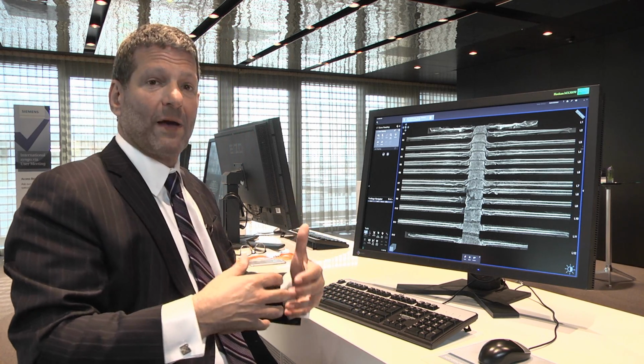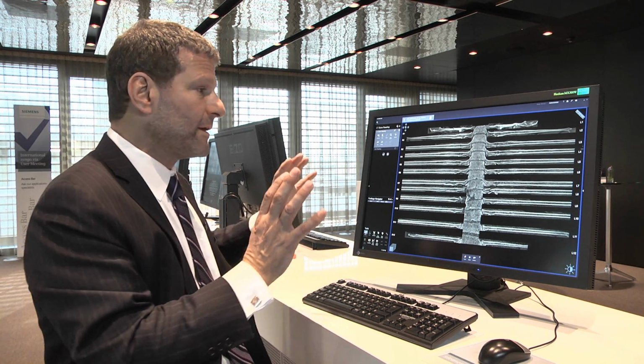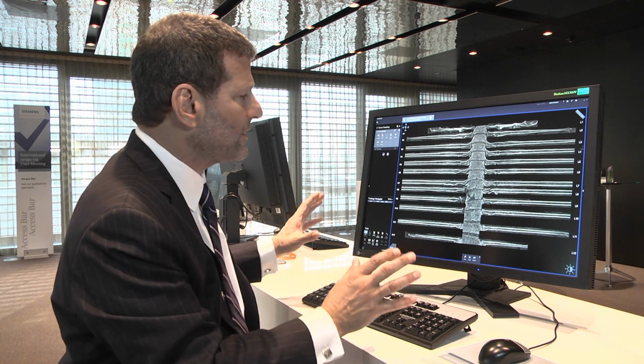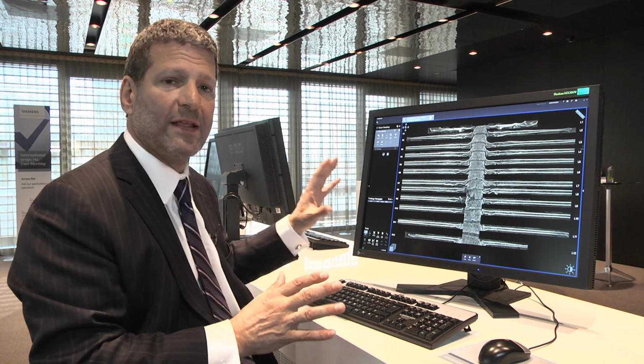Now let's not forget, one of my primary tasks is not just making the interpretation and putting it in a report, but conveying it in a way that I can communicate really well with my referring doctors. And this tool is a wonderful, really spectacular communication tool. I love this bone reading tool. I think it would have great value in everyday practice.